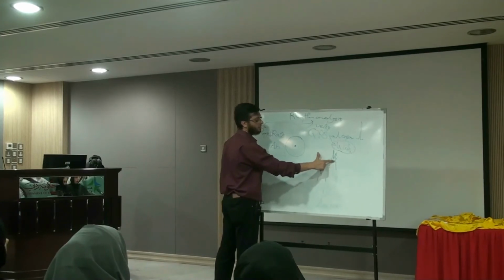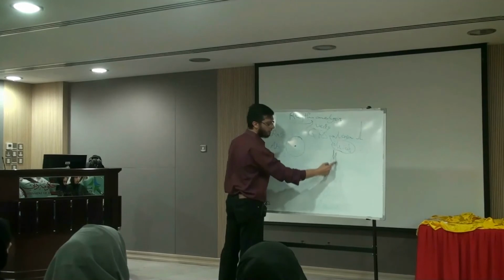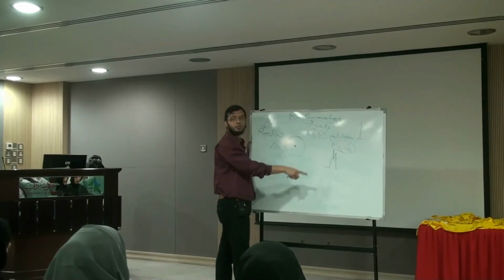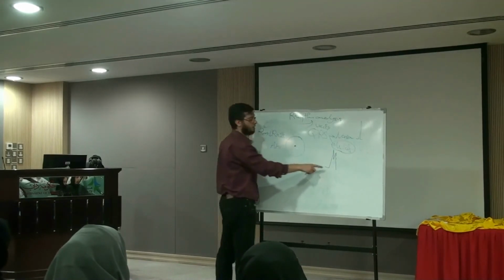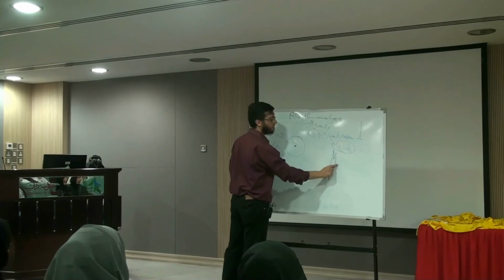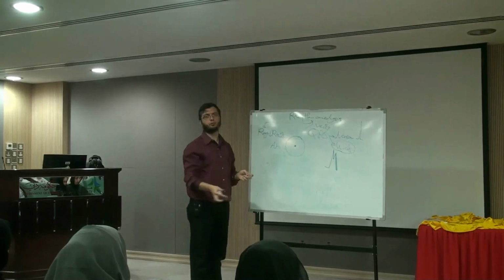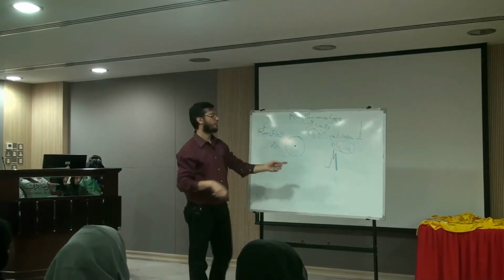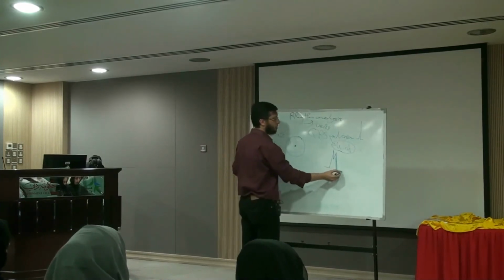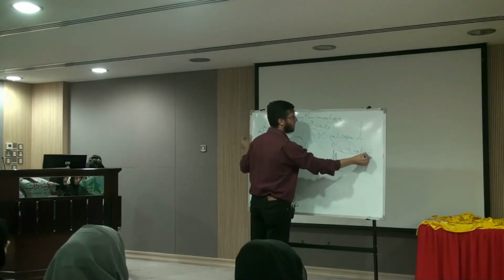So the ECG machine will not go with the left and then go back and activate the right. No, the ECG machine is continuous. So when it activates the left bundle, then it goes and activates the right, you get this shape. What do you call it? The M shape of MarroW. Yeah, you will see that later also. So now you have a wide complex because of bundle branch block.